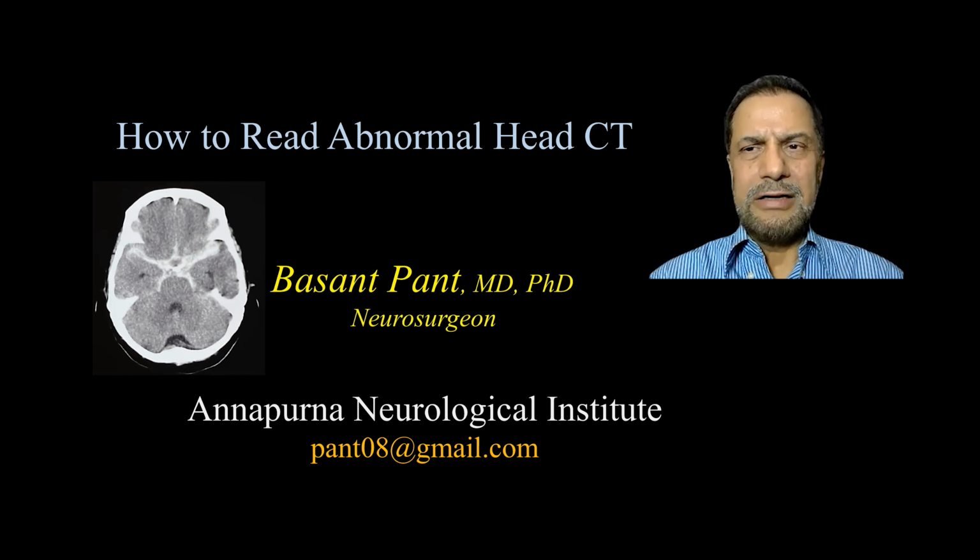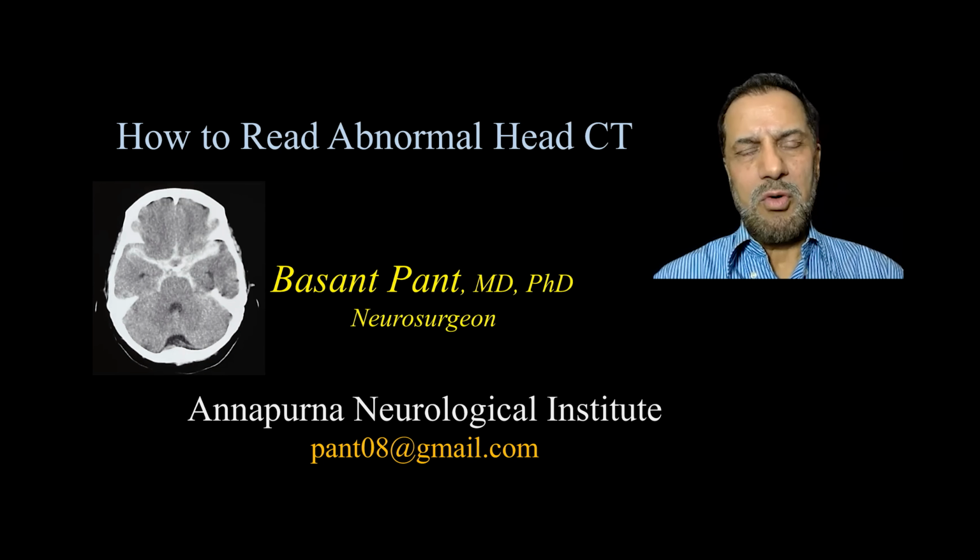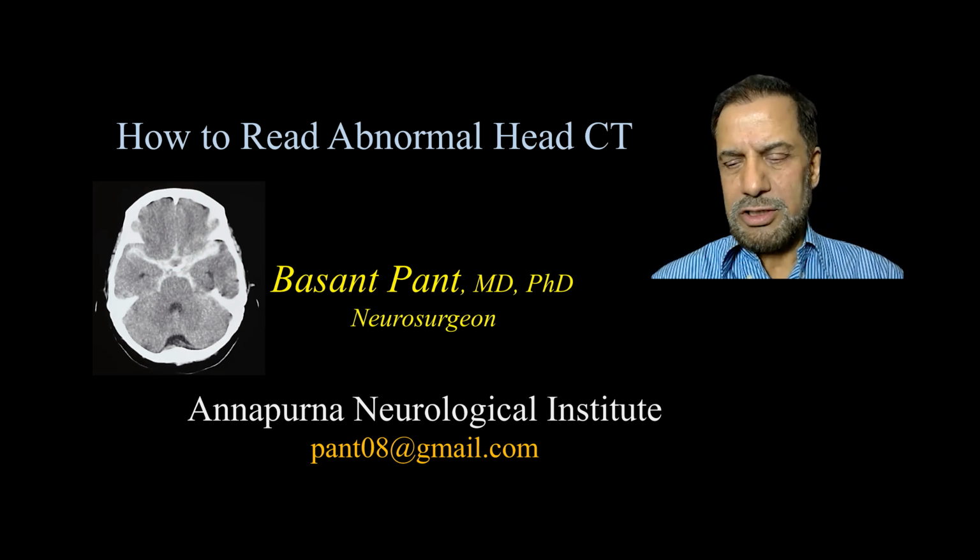Although you will need detailed reporting from the radiologist, at least you should be able to immediately know what is happening, whether you are in an ICU setup or an emergency setup. You need to be able to recognize a few of the important CT findings. So today I'm going to briefly show you major common pathology and how it looks in CT scan.